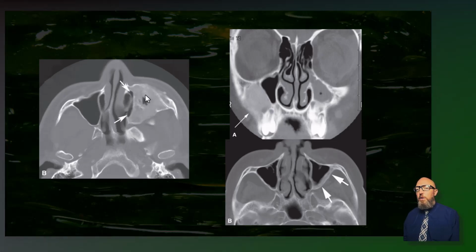And so there is more of a fibro-osseous thing filling the sinus. So again, just a classic fibrous dysplasia. Here's another one, that ground glass appearance. Hopefully right away you're suspecting fibrous dysplasia. I don't see any encapsulated tumor-like thing, so you might want to be ruling out ossifying fibroma.